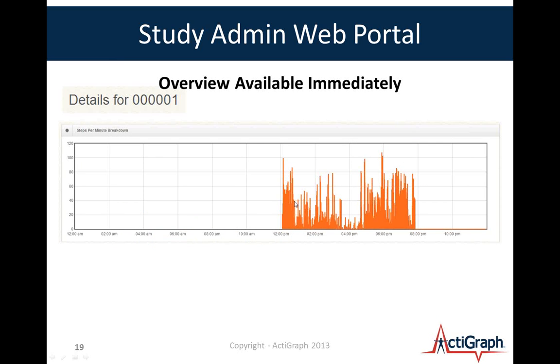And so you're able to get as granular as you're able to get in ActiLife, except you have to pre-configure what you want to see up front. And so I think that's the big difference that you'll see in this system: it is turnkey and it is simpler.